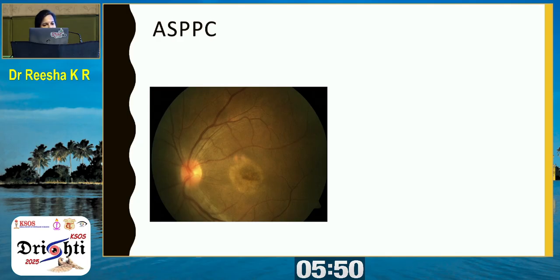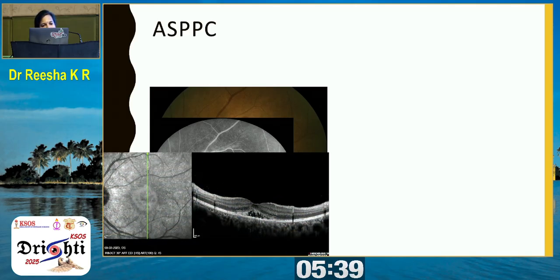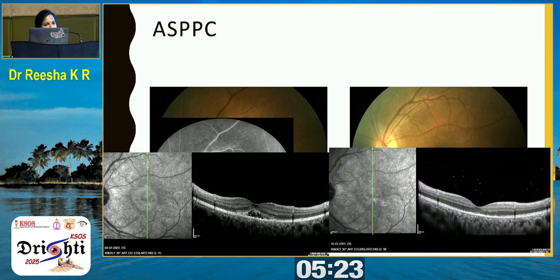Again, another yellow lesion in the macula, but it looks deep retinal. See the FFA, there is disc edema again with vasculitis. OCT shows these deep retinal lesions with granular deposits. See, this is typical of a syphilitic lesion. The patient was positive for VDRL and TPHA and treated with crystalline penicillin, and the lesions resolved completely.